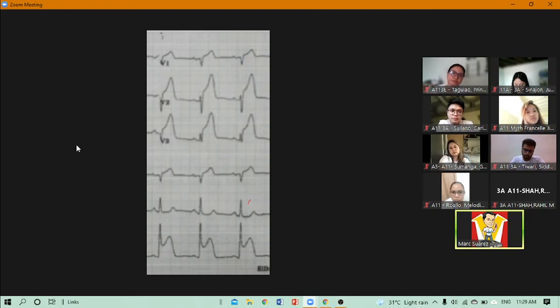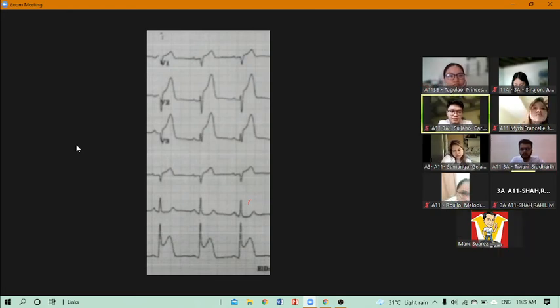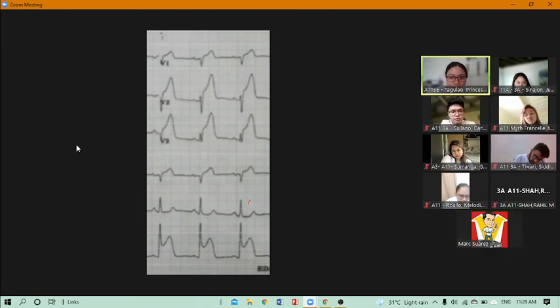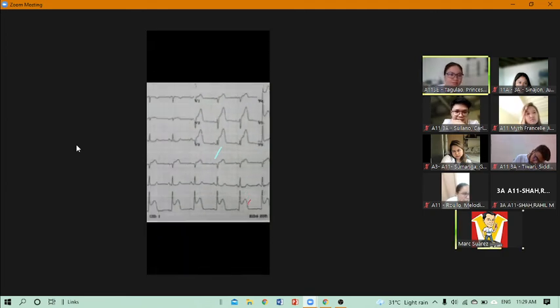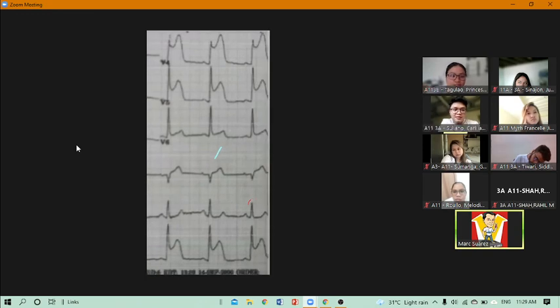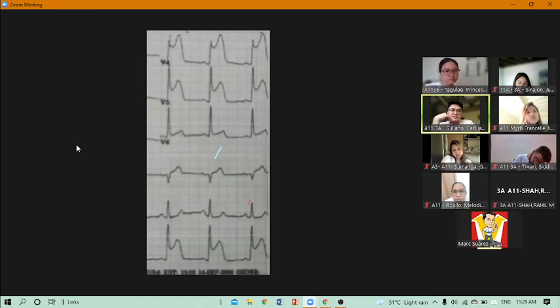How about V2? Elevated, Doc. Okay. So please make a note. V1, V2. How about V3? Elevated. Okay, wonderful. How about V4? Elevated.